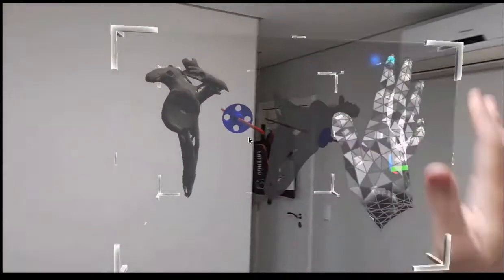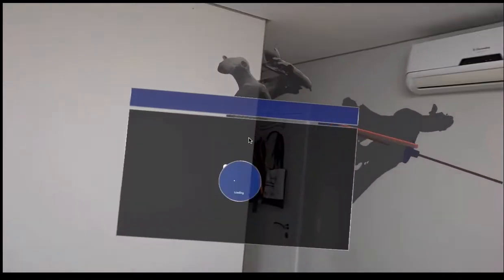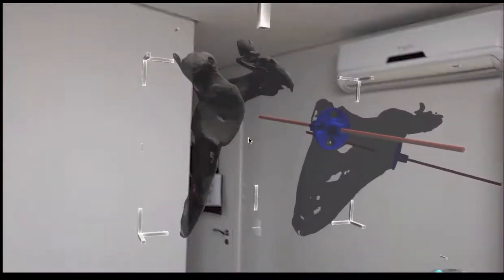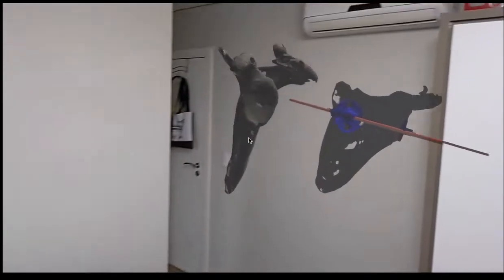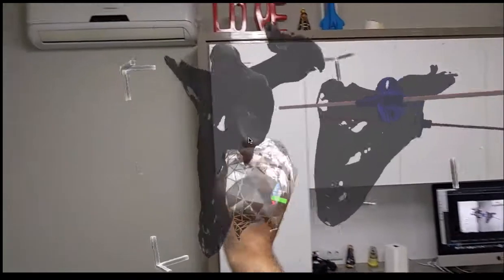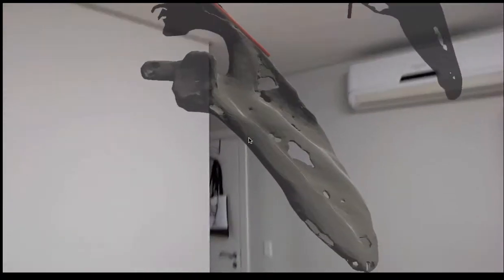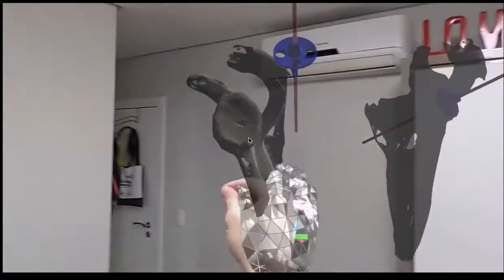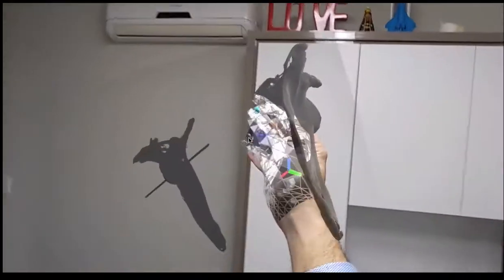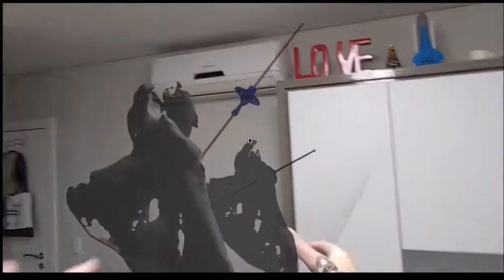Okay, this is an example of a mixed reality model that I can join. This is a scapula that you can see here. We can turn it to see everything around this scapula. I can check the retroversion. I can move it around. I can see directly through it. In this case, we are using an evolutive model.